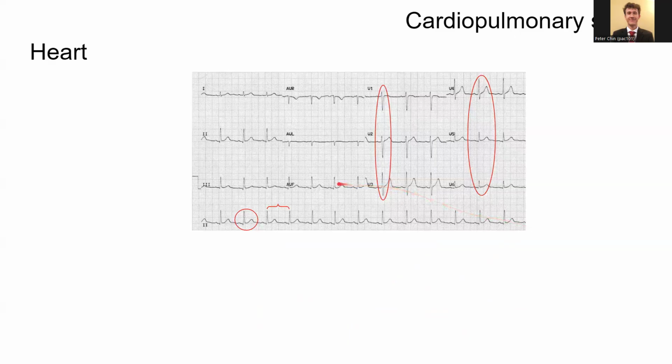Here's a normal EKG, and on it I've circled some things that I pay attention to when I'm going through an EKG. Your approach to interpreting EKGs may be different from mine, and that's not to say that yours is wrong or mine is right. But if you have no idea how to approach an EKG, maybe my process will help you initially, and then you might develop your own.